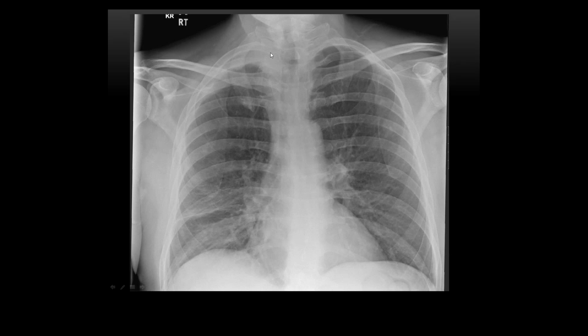Good. So can you all see this up here? All this thickened pleura in this apex that isn't comparable to the other side. If you have biapical pleural thickening, you can look at previous chest X-rays and it's probably been there for a long time. However, when you have unilateral pleural thickening, and the textbook says greater than 5 millimetres compared to the other side, you've got to be a bit concerned.